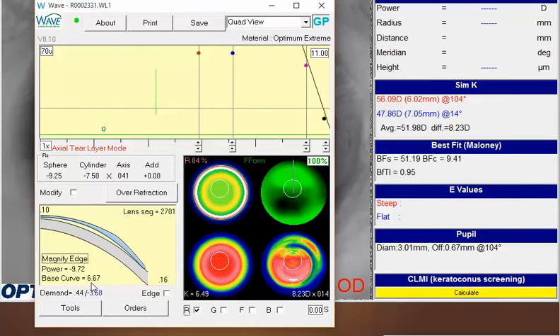Now I understand from your diagnostic lens that you placed on the eye, a lens that was about 6.20 or 6.19 in base curve seemed to give you a reasonable starting point. So we need to figure out how to incorporate that data into this lens. Now I mentioned in a previous training to use the tools data.